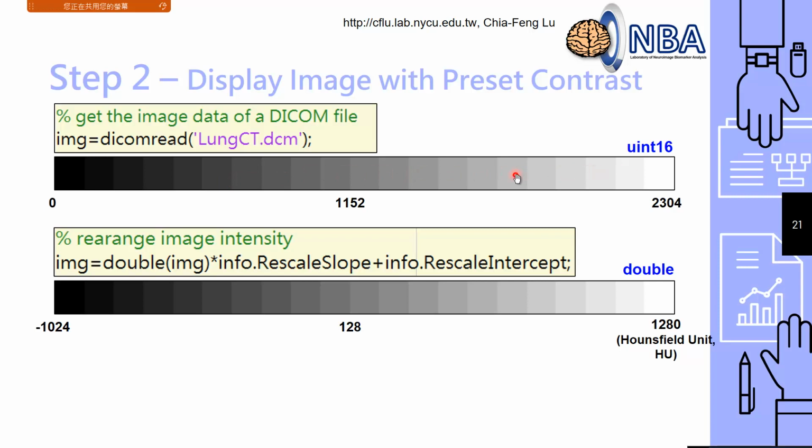It's more like a ladder. I can see white, less white, less white. I don't know how to say that. It's more like gray, but we still have different levels of gray, right? So we say this is a grayscale. But right here, just take a look. If you simply use this command line right here, let me show you.